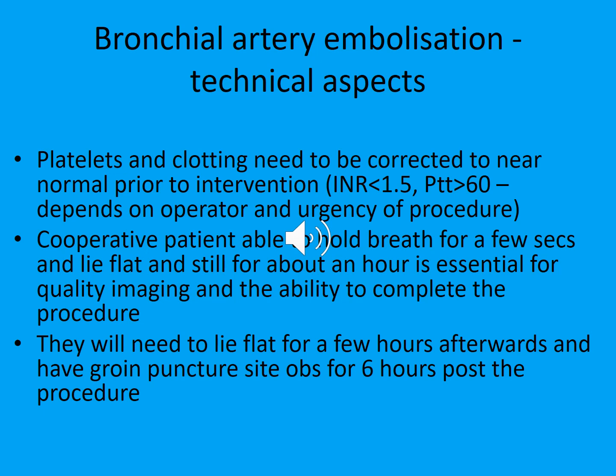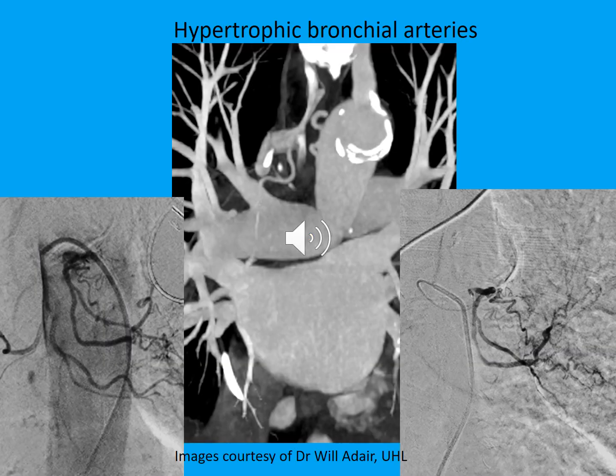post the procedure. Here's another example of hypertrophy of bronchial arteries on CT and on angiogram. The images and comments were kindly provided by Dr. Will Adair, interventional radiologist here at UHL.